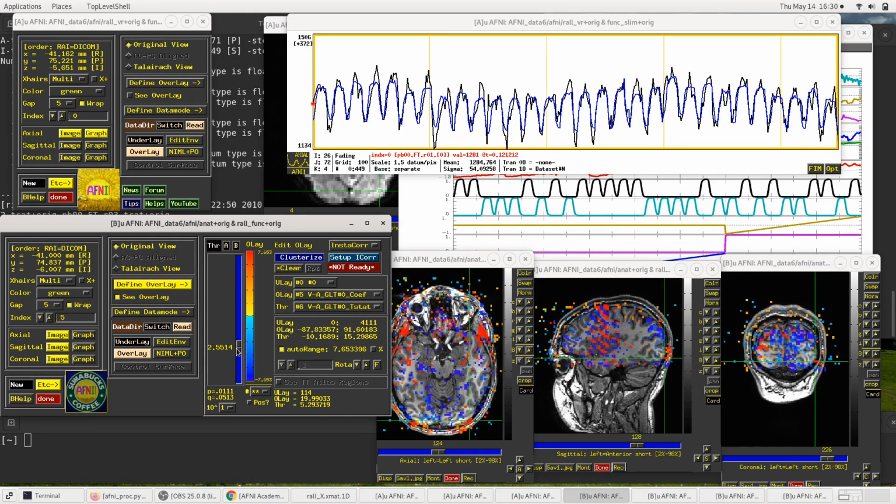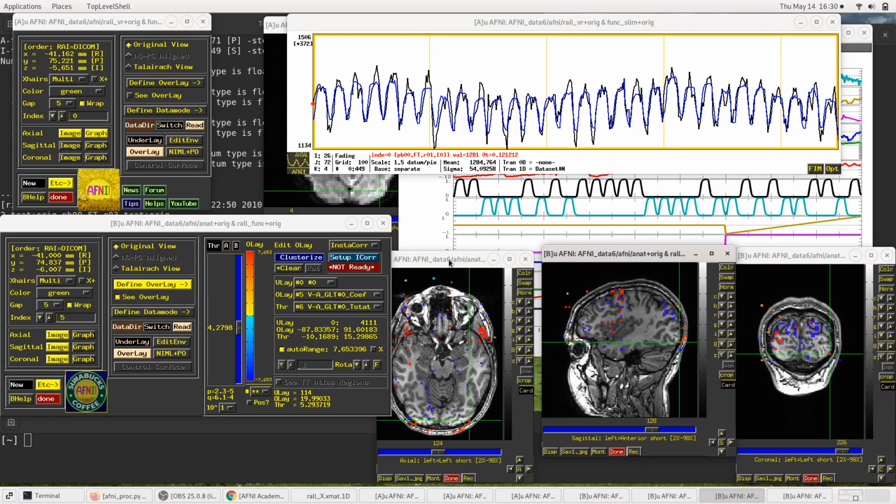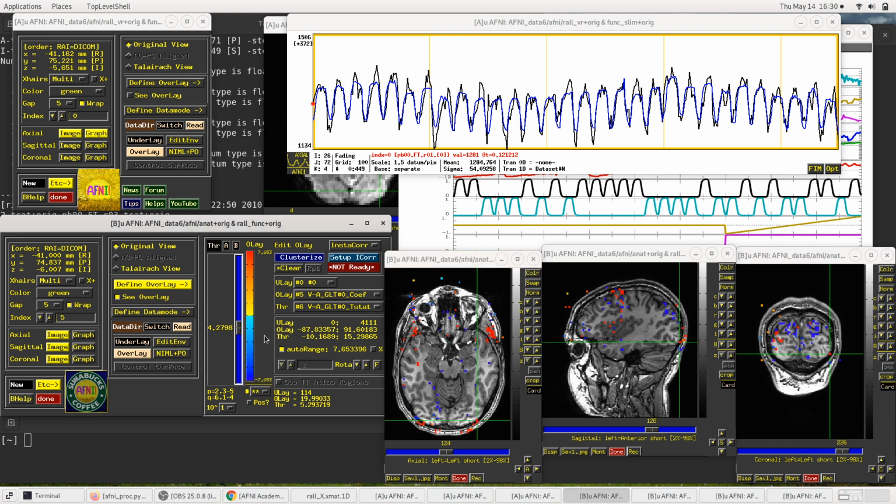So if you don't know where to threshold, when you're just looking at data and playing around a little bit, trying to see what is in the results, a common way to threshold, just to get started, is to raise the threshold until most of the speckles outside the brain disappear, whatever that happens to be. Or you can set a p-value. Let's do that alternative.